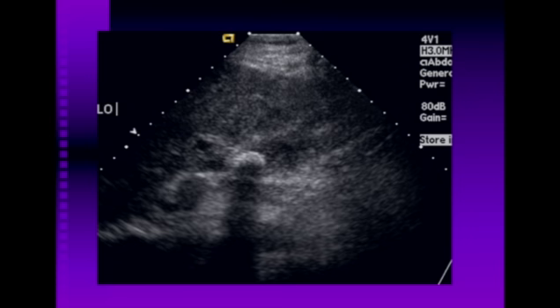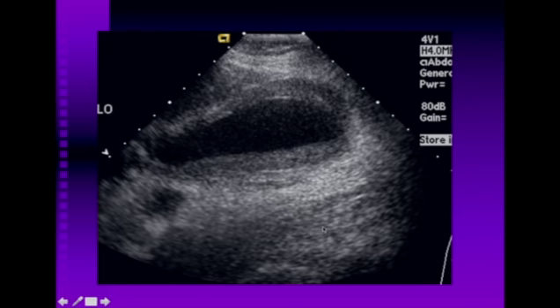All right, here's another example. On this image, looking at the gallbladder in a longitudinal plane, we see this sort of rising moon type of appearance, round structure, brightly echogenic with shadowing, so we're saying that there's a gallstone. And now we look at the gallbladder itself and we see diffuse wall thickening. Notice you don't want to measure the wall as it's lying against the liver because there's some tissues that are very loose in that region and can simulate wall thickening. But we do also have this layering sludge in addition to the stone that I've already shown you.